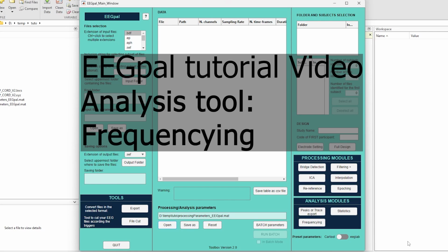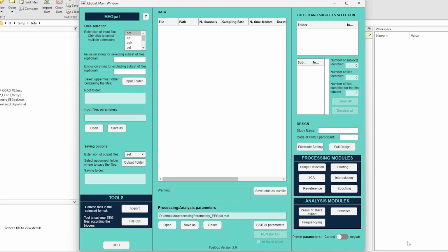Welcome in this tutorial video. We are going to see how to perform a frequency analysis with EEGpal. The idea is to study the brain waves, which could be used as biomarkers or to study the sleep states.